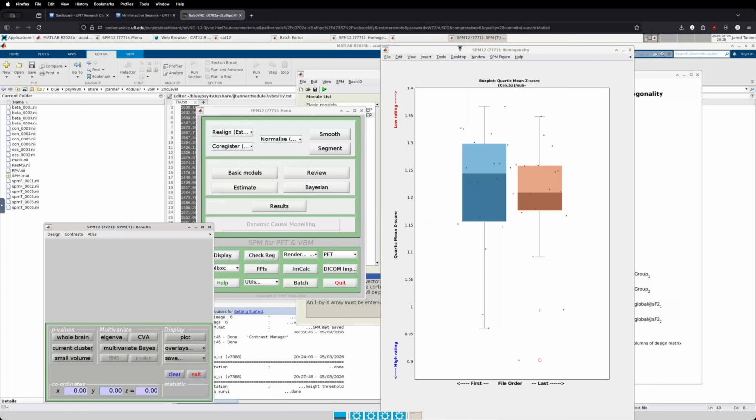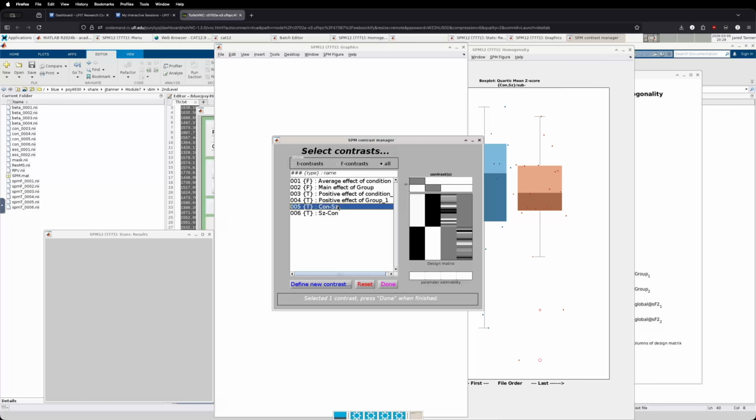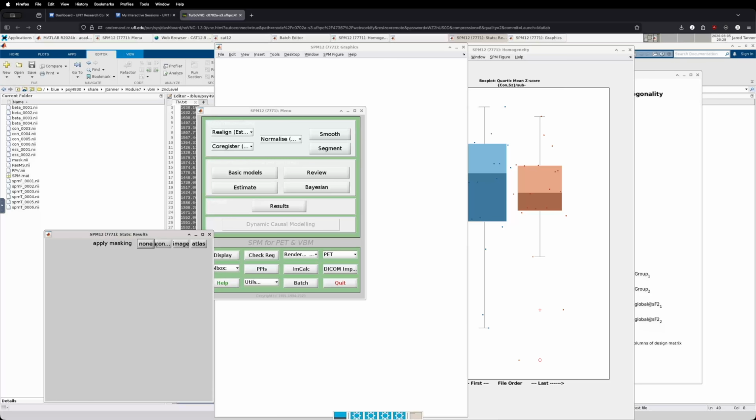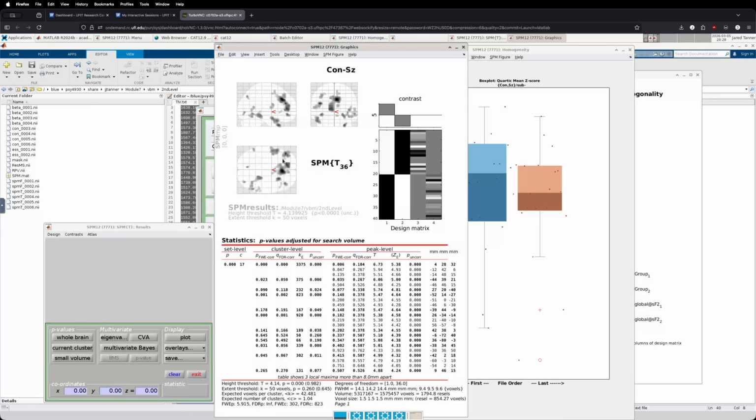Now, just for interest, I'm going to be a little bit more generous with thresholding. So I'm going to go back to our control minus schizophrenia. I'll do none there. We won't do a p-value adjustment, but I'm going to make this less than 0.0001. And then I'll still put 50 voxels in there. So if we look, there's quite a few spots in here.